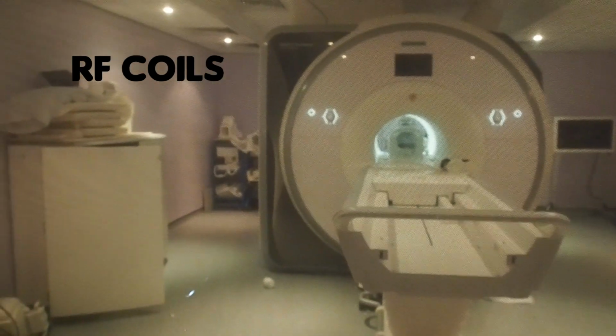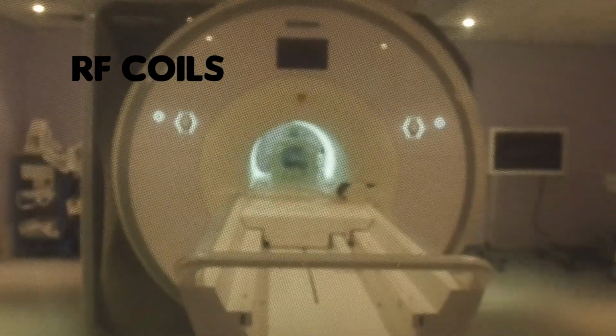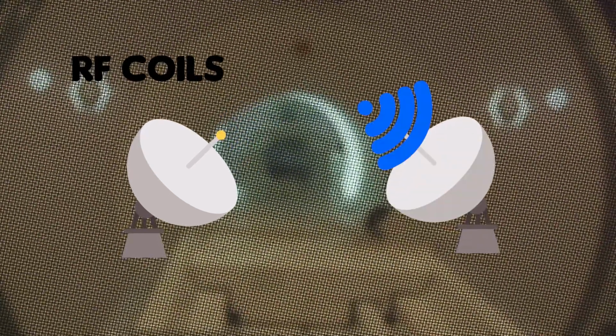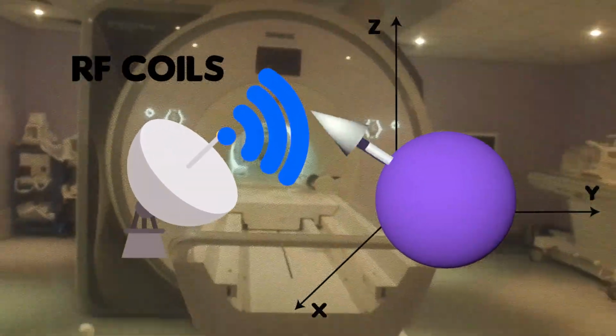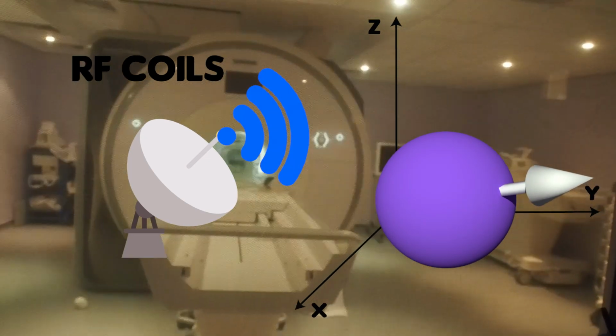Radio frequency coils are used so we can see the MR signal. They may be considered as the antennas of the MRI system. The radio frequency coils have 2 functions, transmit and receive. The RF coil transmits the excitation pulse, which rotates the net magnetization away from the main magnetic field in the Z plane to the transverse XY plane.